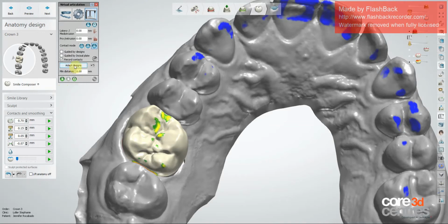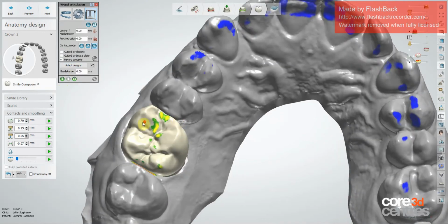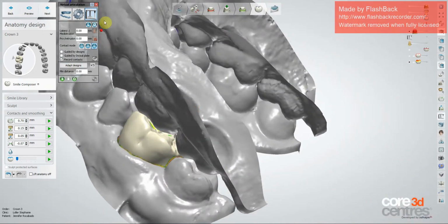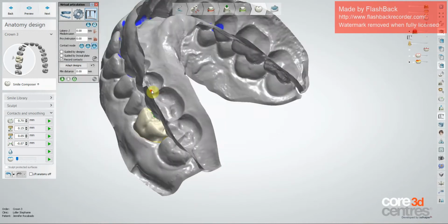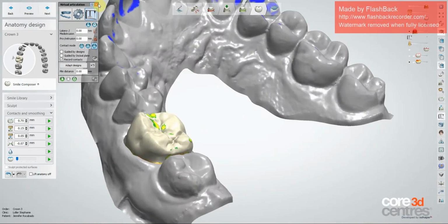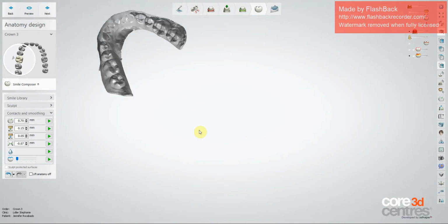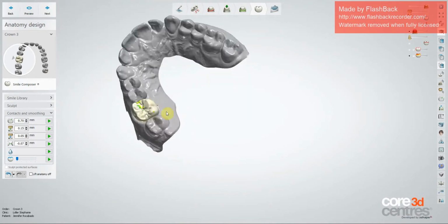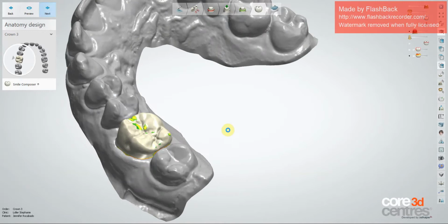So you just hit adapt design, boom, and it'll automatically remove. I don't want that to happen. It'll just spoon it out. It just looks terrible. So I preset things ahead of time to where I don't have to use it. I do this as an insurance policy, but I don't want this to be changing my design. Okay, now that that's set, everything is done. Looks beautiful. Still looks just like the original design.